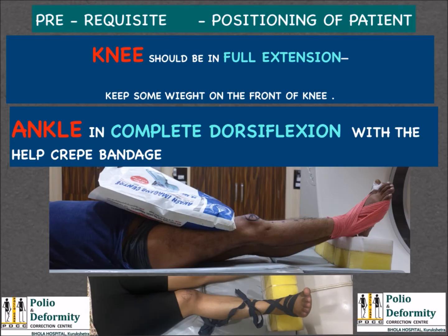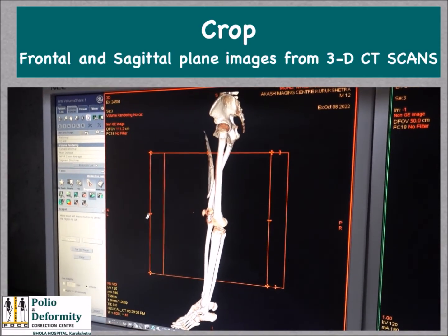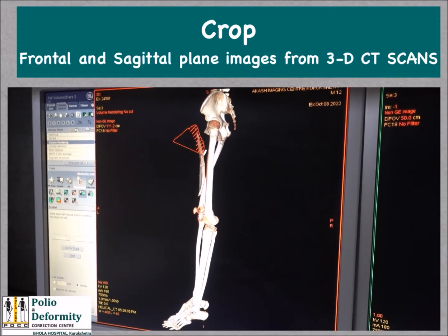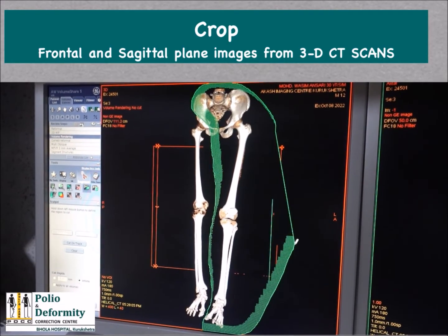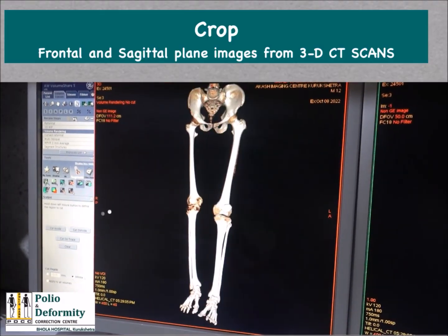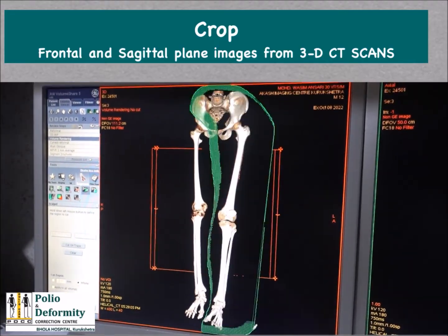And you can crop the images for sagittal plane as well as frontal plane, like this. And then you can crop the side which you want to see, left side or right side or both the sides.